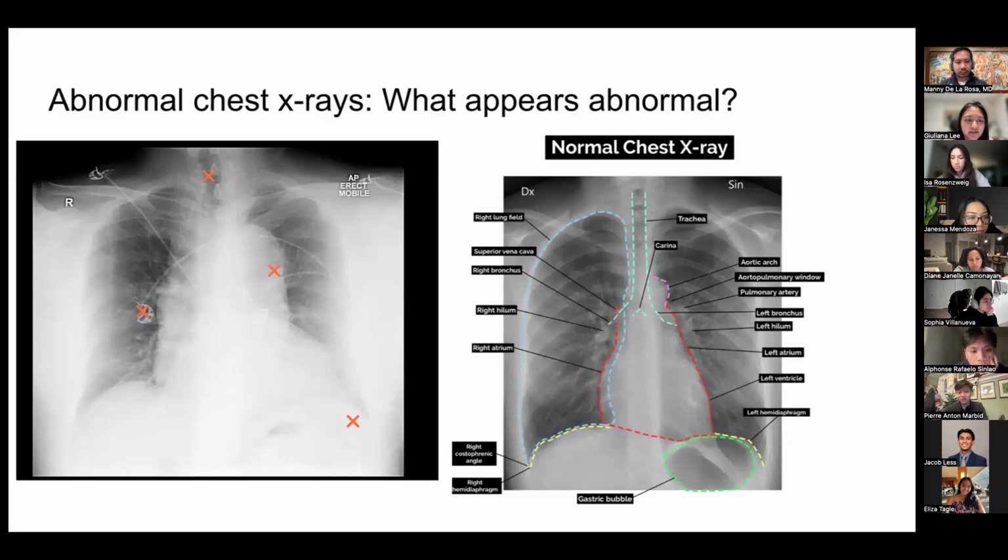All right. Feel free to put more stamps as we go. But let's get started, sort of same thing. I see an X up near the neck area of the chest X-ray. Would someone like to maybe call out what they're seeing there?